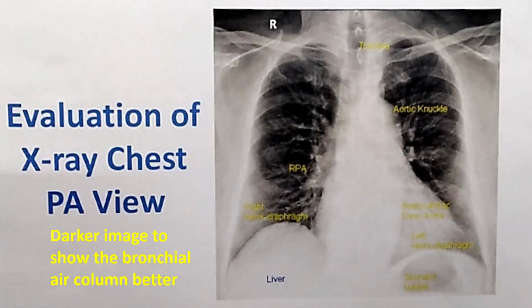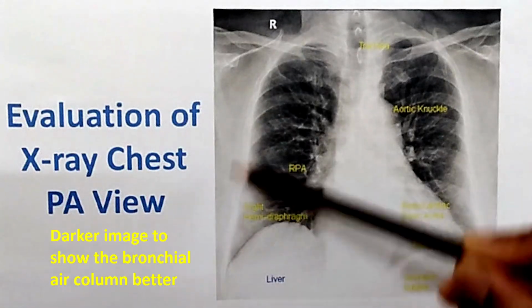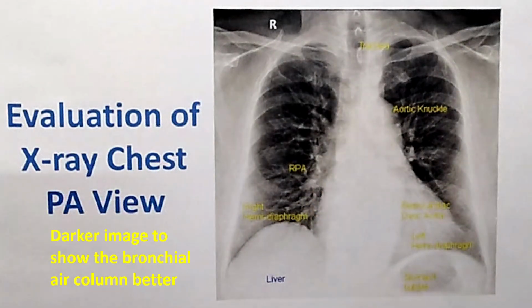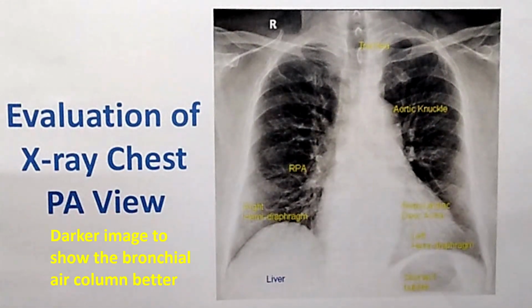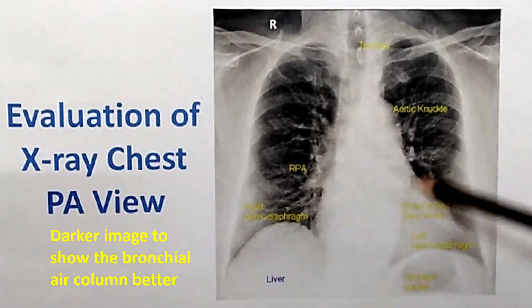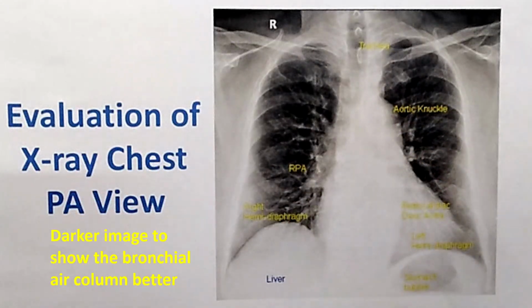That's all normal. And you can look for air in this region, subcutaneous emphysema, sometimes in those with chronic cough or following a trauma or even certain surgeries, you may have air in the subcutaneous plane. Subcutaneous emphysema can be missed easily unless you look specifically for that. And in rare cases, there could be mediastinal emphysema or pneumomediastinum, which have to be looked for specifically. Otherwise, you're going to miss it.